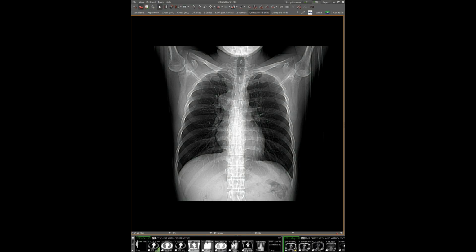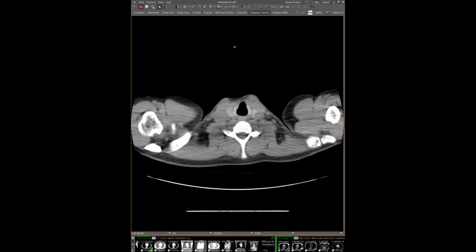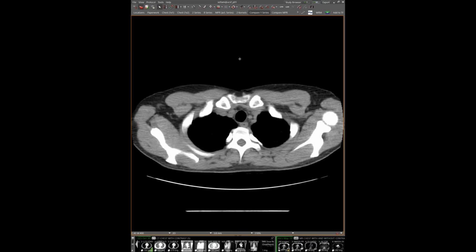All right, so this is my first case. We unfortunately don't actually have a radiograph on this patient, so I'm going to use the Scout. We can see here that the patient has an abnormality in their upper mediastinum along the right side, and our pretend lateral from the Scout shows that it is in the anterior part of the mediastinum. So we are dealing with an anterior mediastinal mass, and obviously as this is a Scout, we do have a CT. So this was the initial CT that this patient has.